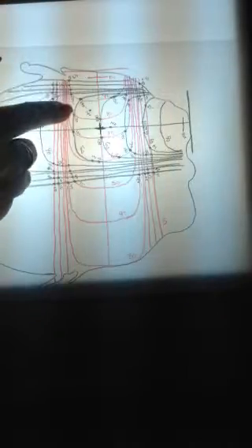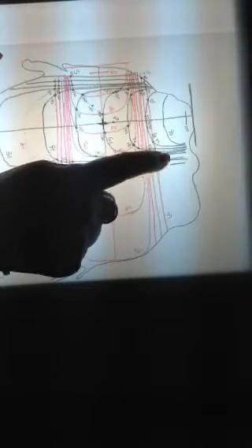For example, here there's 140%, 140%, 140%, another 140, another 140, 150, there are 130% out here, 120%, 110%, and so on. So it'll be your job then to start by looking to see where the beam lines intersect each other and then adding those doses and, using a very sharp pencil, writing down the additive dose.